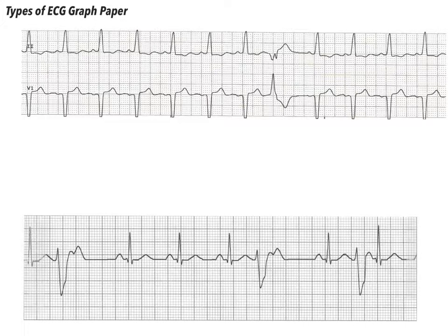We know that these two papers are going to give us a graphical representation with the waves added to them as far as what the heart is doing electrically. All right. The top one is called a dot matrix paper. Dot matrix. Look at it carefully. You see all those dots lining these? Inside of those big boxes, that's what they call a dot matrix. Those dots are supposed to represent the corners of the smaller boxes that were there if we're looking at something like this. Okay?